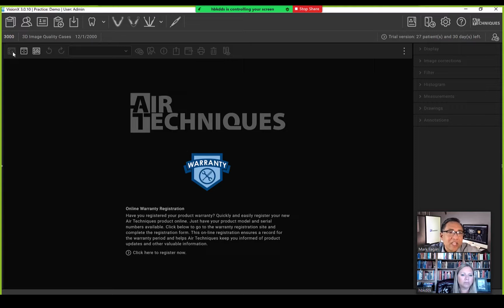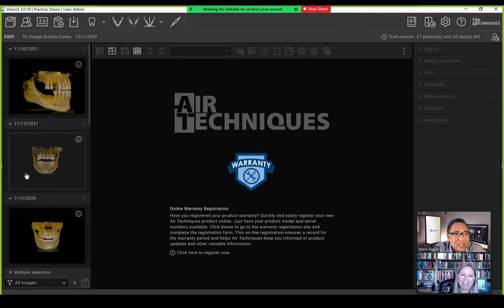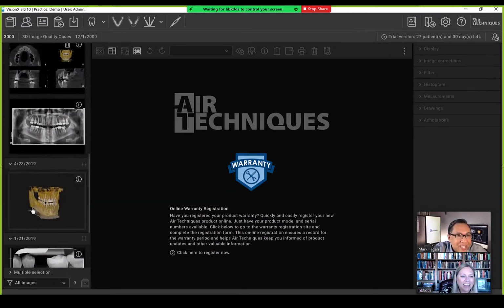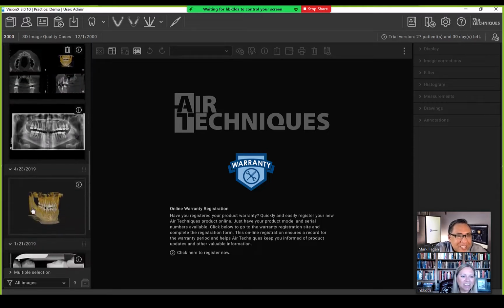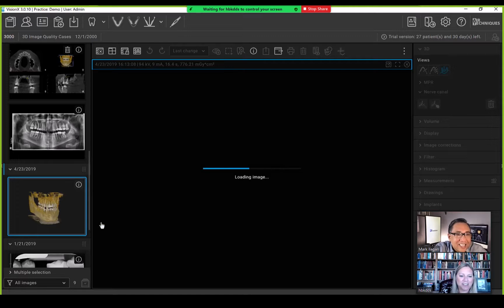Oops. Here, let me go back. It's the beauty of having software you've never used before. I think it was this one. Oh man, did I kill it? I forgot which case it was. One that has a simple bone cyst or an odontogenic keratocyst.